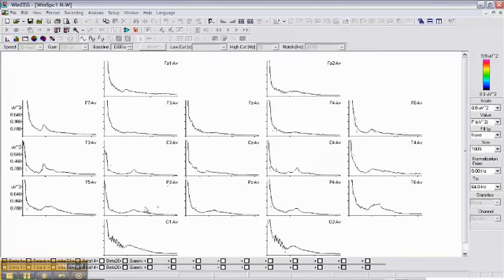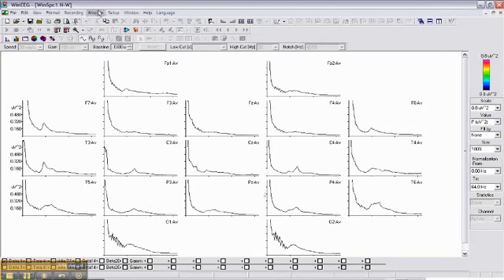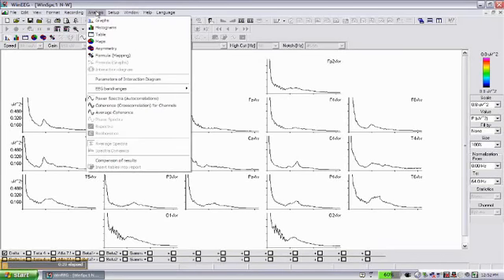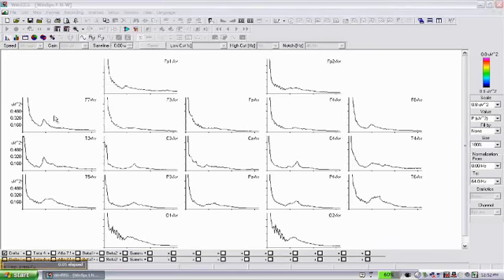We got the spectra for this subject. We computed spectra for this patient. The spectra are presented on the screen, so for each location we got the spectra. And now we can compare the spectra with the database.